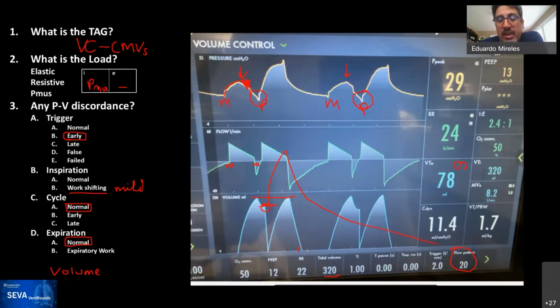And that's why you don't see it, it disappears out of the scale, because it's going negative, because it's now exhaling the tidal volume from before and the tidal volume that you delivered. So these two are coming out now, and then the patient gets another breath. And actually, you can see that there was an amount of air trapping in this passive expiration. So this tells us that this patient is not only getting extra tidal volume every time the patient has that increase, but number two, that there's an amount of air trapping. So now you're overdistending, you're getting extra volume on top of that volume on top. Go ahead, Rob. The interesting thing is, if you look at the digital display, it looks like there's nothing wrong.